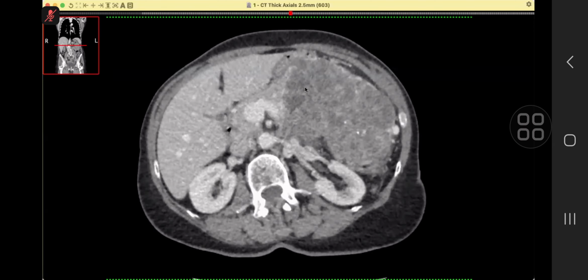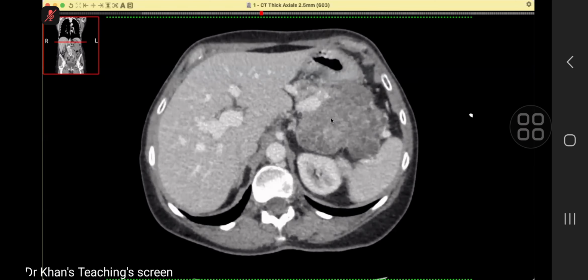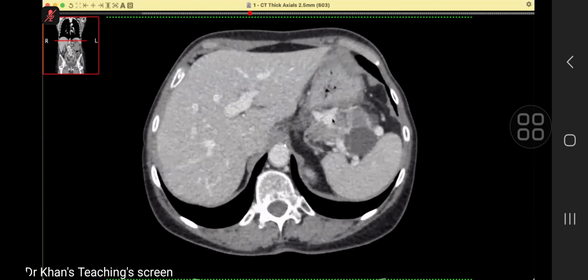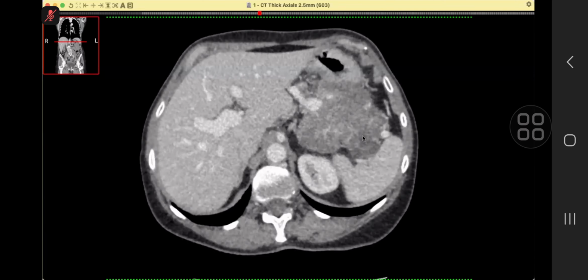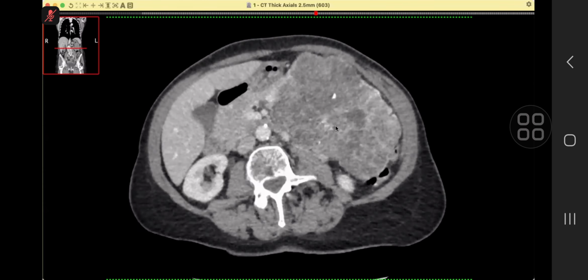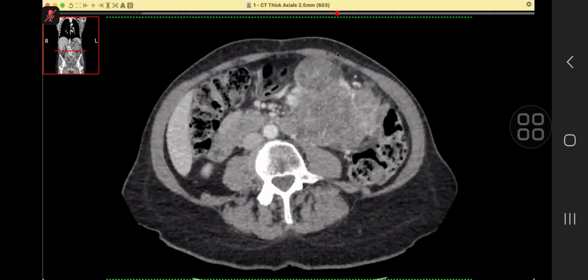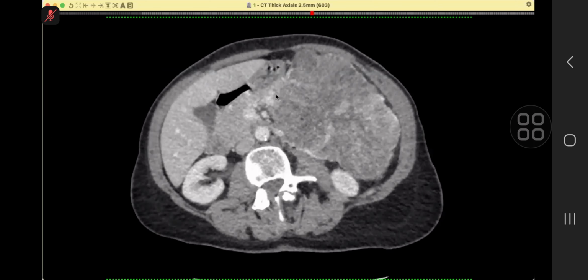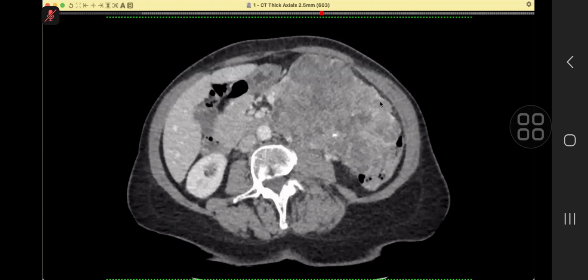And then if you look carefully, all of these are very small cysts actually, which project like this on a CT scan. And in the periphery, you might find larger cysts. And then there is internal calcification. So please remember, in serous cystadenoma, the calcification is central. And then look at the outline, and you can convince yourself that it is a lobulated outline. Look here even. It is lobulated. Why is it lobulated? Because there is a cyst which is causing an impression.